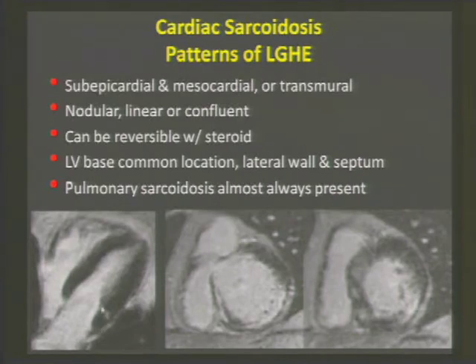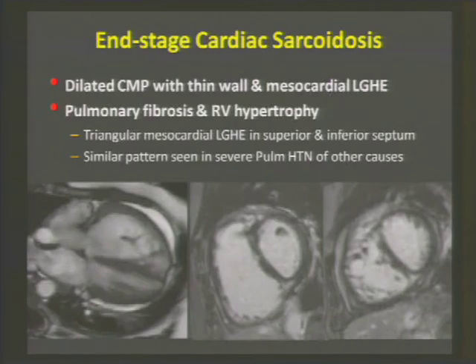This is a different patient here. We can see that it's nodular. Every case that we've had of cardiac sarcoid in our clinical practice, the patient has had pulmonary sarcoid. So if we don't have pulmonary manifestations, we usually do not call it. If they biopsy it, they may get an answer, but the problem is that this is a patchy involvement of the ventricle, so it's very important that they biopsy the correct location. So it may have a false negative with biopsies.